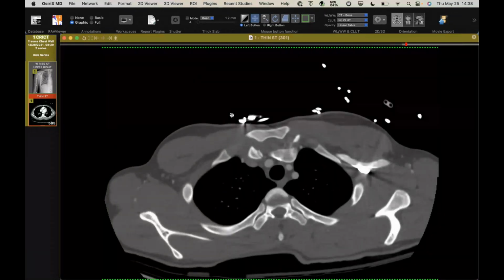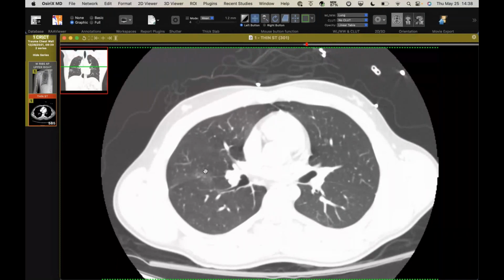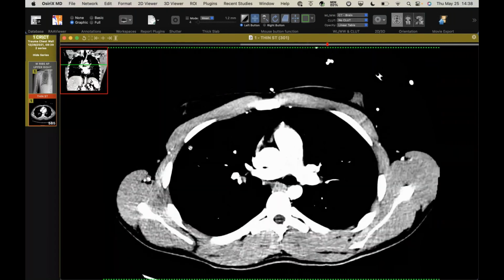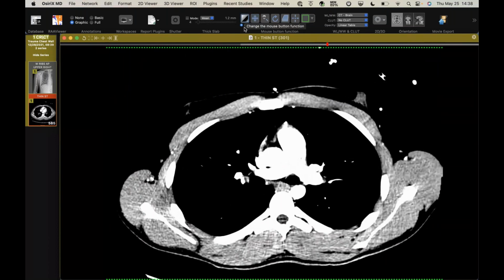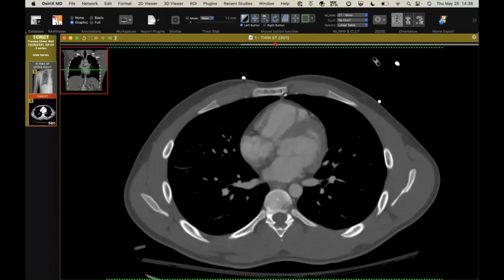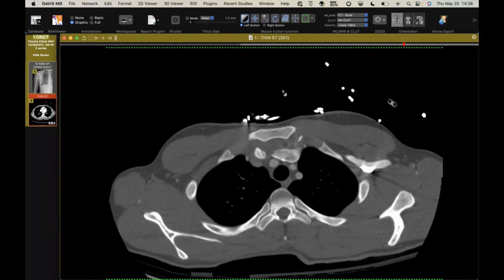I think he did have some small contusions. He had this nice little contusion down here, a little tiny laceration, but that was the extent of it. So he got really lucky. We were trying to figure out, these ATVs are sometimes driven on trails but also on farms. Because they're not wearing seat belts, they crash into the steering mechanism, and that could cause a direct blow. Or if you got thrown off and hit something, that would cause a direct blow too. But enough force to do that, just a cute finding.